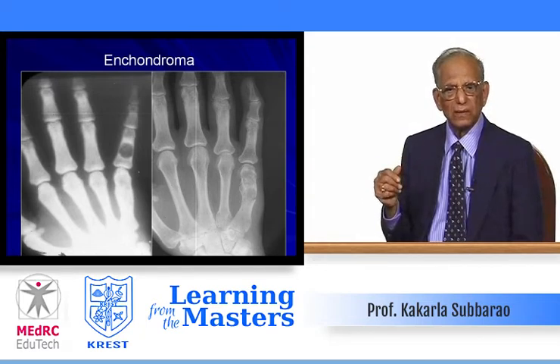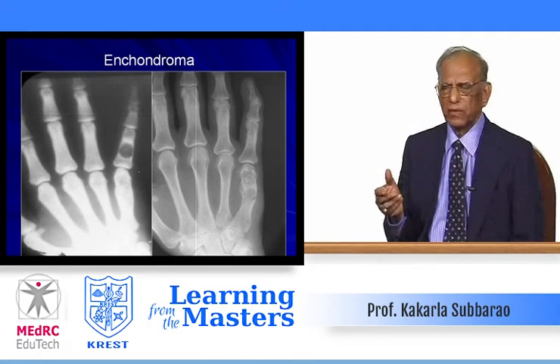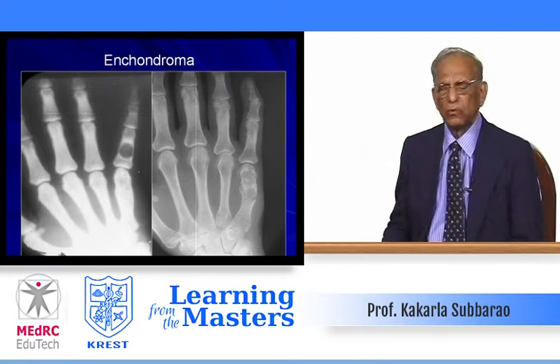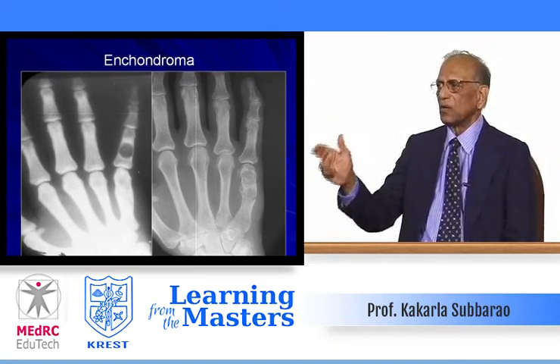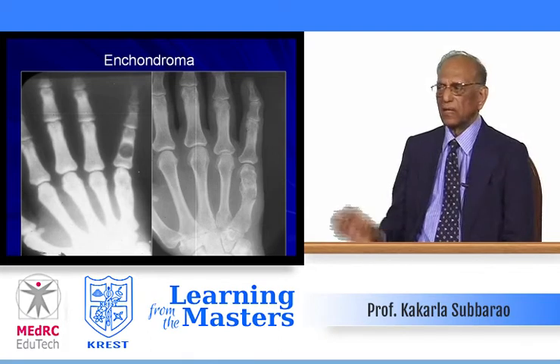How does it heal? Mainly by incidental fracture or trauma. Of course, they call it spontaneous healing, but it must be some trauma-stimulated new bone production. One on your right hand again, chondroma with a pathological fracture, lobulated lucency with calcific densities, classical of chondroma.